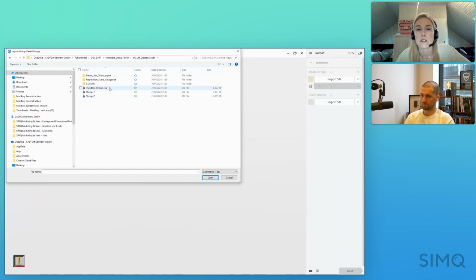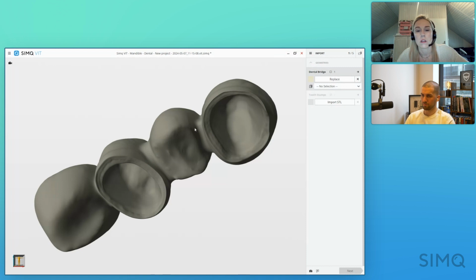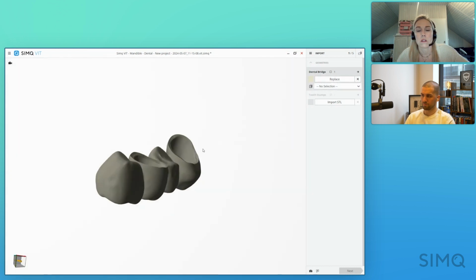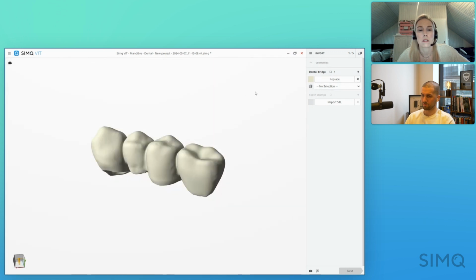Okay, so see here we have the dental bridge. So we're just going to click it. It takes STL files, so you just click on that and open. So very simple here. You can see this is mandible. And also the materials that I spoke about, we have a big library of materials, but these are also customizable. So that's a great thing about the software. So for example, for 3D printing, a lot of people use 2.3, from what I've learned.